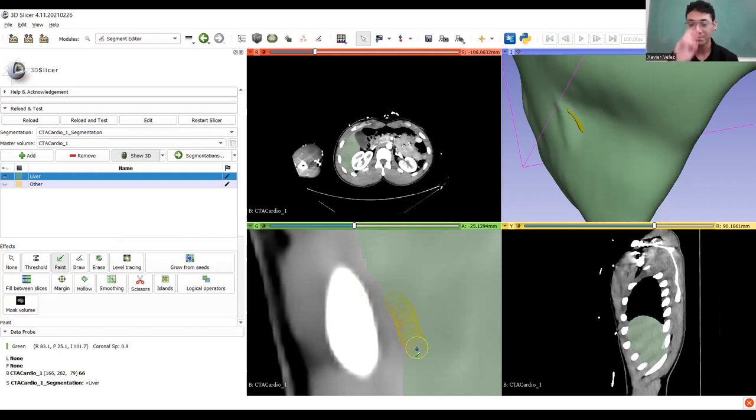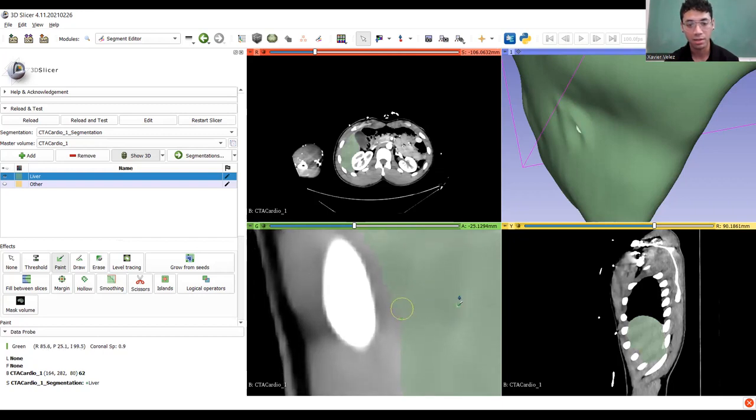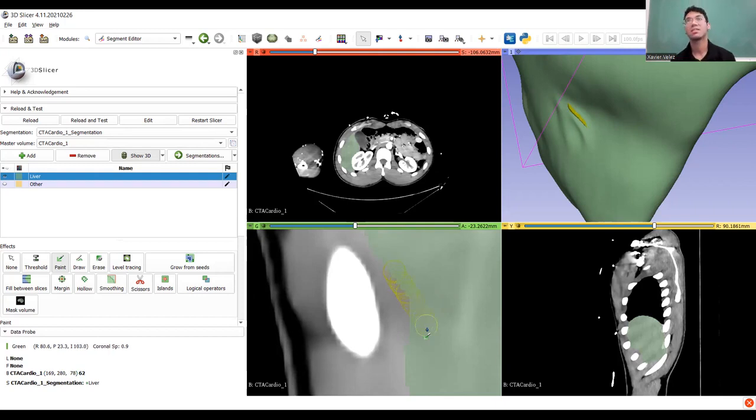So nothing that you should necessarily be worried about, but just something to keep in mind if you're a little nervous about going in manually, especially for things like the heart that are a little more complex. Ooh, that looks bad. They might need a more accurate touch. Save along the way. It'll help you in the long run, for sure.